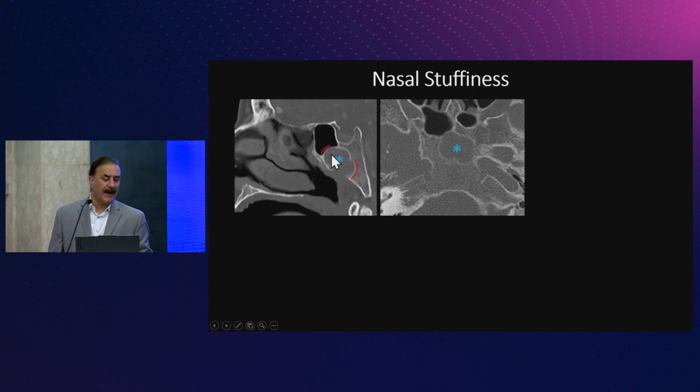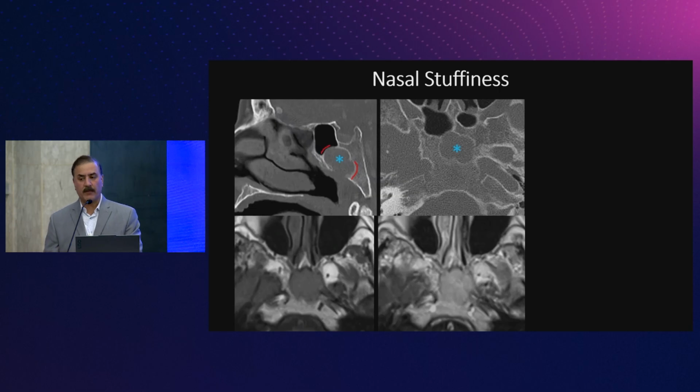But we are very high up here. As I said, remember that curve that I showed you? The curve comes more posterior, so usually the fossa navicularis magna is right here, so it's likely not going to be that. But still, on CT, you're not going to answer this question, so we went to MRI.